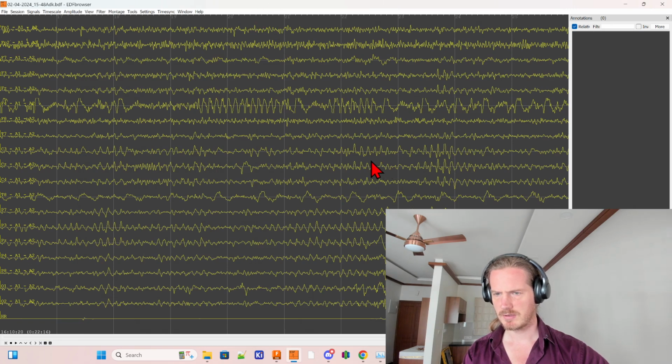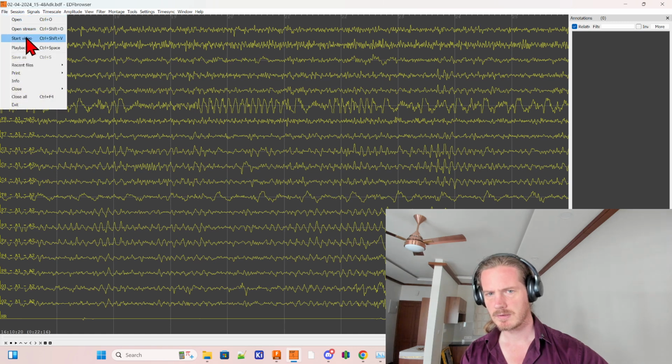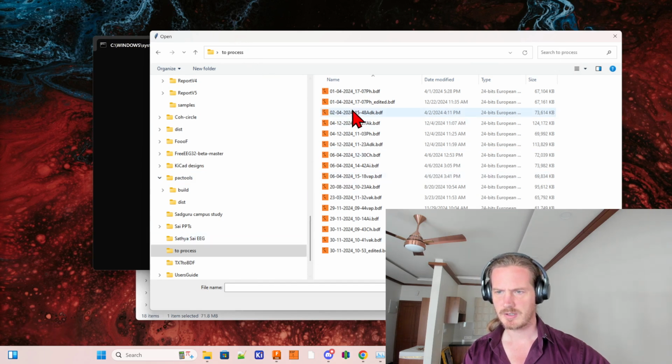Didn't we save this? Where is it saving to? Oh, this is not it. Where did it save to?